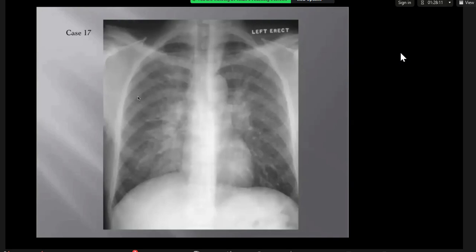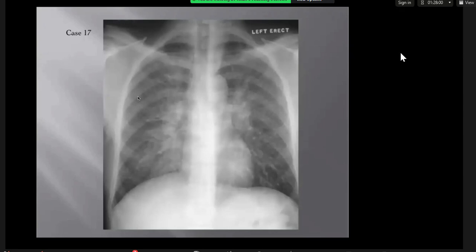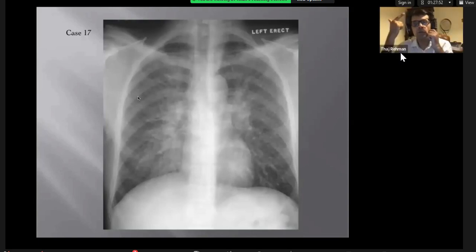Again, I will keep interstitial pulmonary edema, although there's no sign to suggest cardiac enlargement or effusion. Will there be hilar lymphadenopathy in interstitial pulmonary edema? No. Fibrosis can also give you hilar lymphadenopathy sometimes, but there's no volume loss here. It's very unusual for UIP or idiopathic pulmonary fibrosis to have this degree of bilateral bulky hilar lymphadenopathy. You can have mild enlargement of mediastinal nodes and hilar nodes in IPF as part of the inflammatory process, but that's quite small and you will not see this degree of bulky hilar lymphadenopathy.